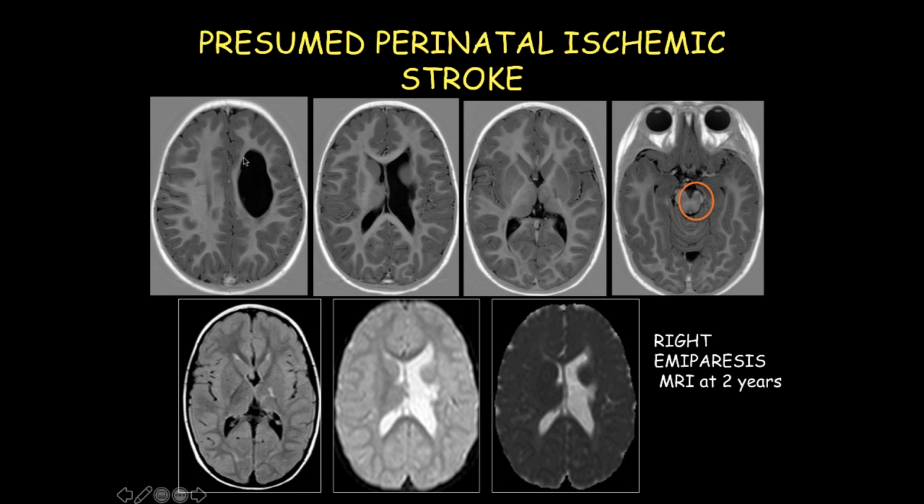This porencephalic cavity causes an attraction on the ipsilateral ventricle, and there are also areas of suffering in the ipsilateral corona radiata and posterior limb of the internal capsule. Moreover, we can see here in the last image an atrophy of the left cerebral peduncle. This is related to a condition called Wallerian degeneration, because after the suffering, we get neuronal and axon degeneration of the tissue.